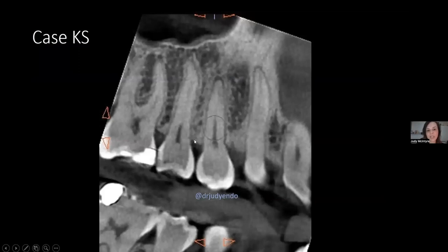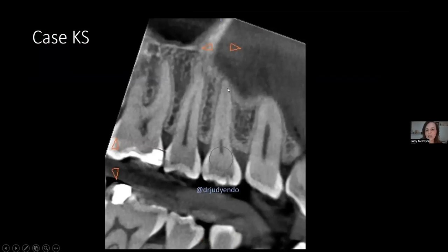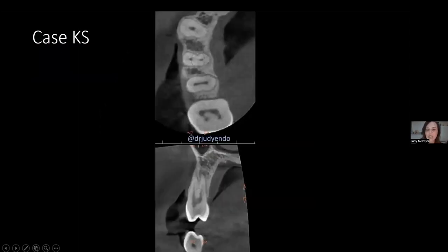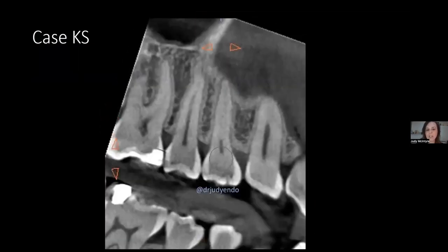And again, not really any mind-blowing radiographic 3D or 2D findings. But yes, that periapical lucency is there. And I looked hard. I looked everywhere. I'm like, what is the cause? No real significant crack. If you're keenly looking at these 3D images, though, you can see that the tooth kind of has a lopsided mesial wall, right?